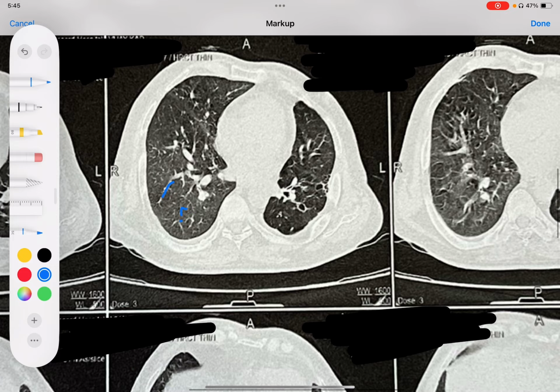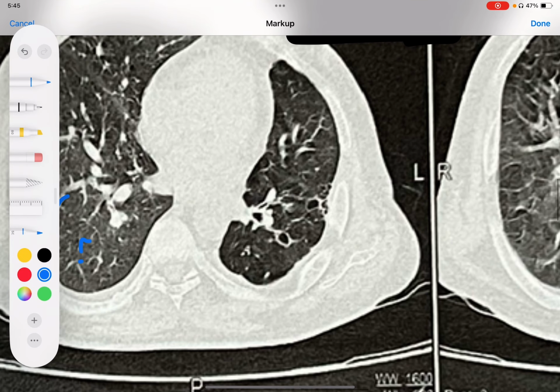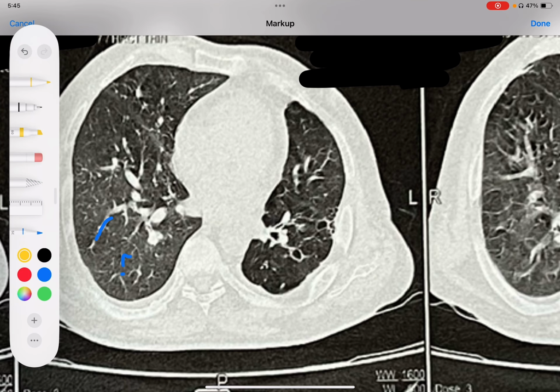There is one more interesting thing which I need to show, just look at this area and this area. These three things. Actually, we can see that the black thing inside means this is air. The black is air because this is HRCT, which is X-rays. Air looks black on HRCT or X-ray. HRCT itself is an X-ray only. So the black is air.